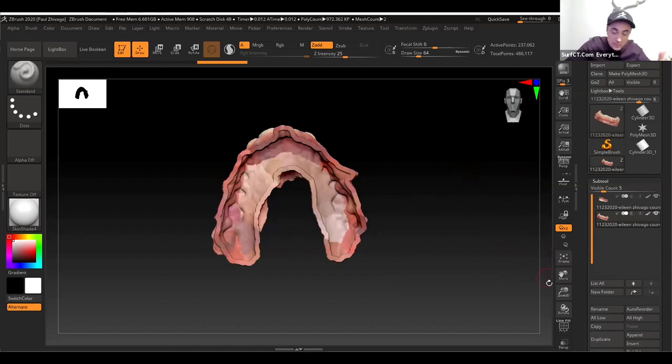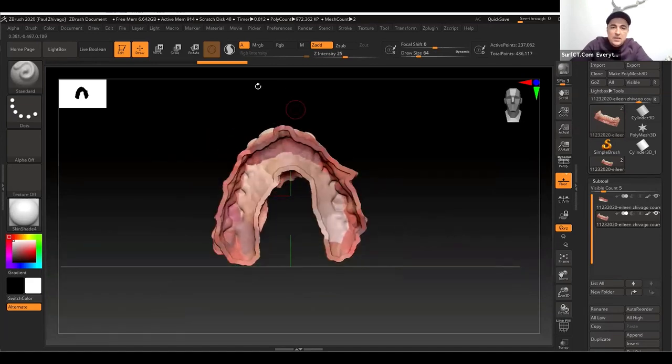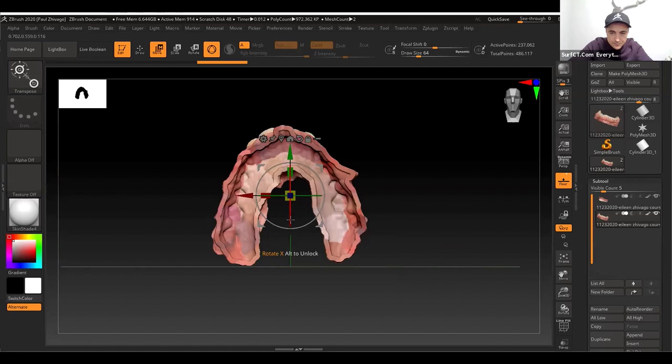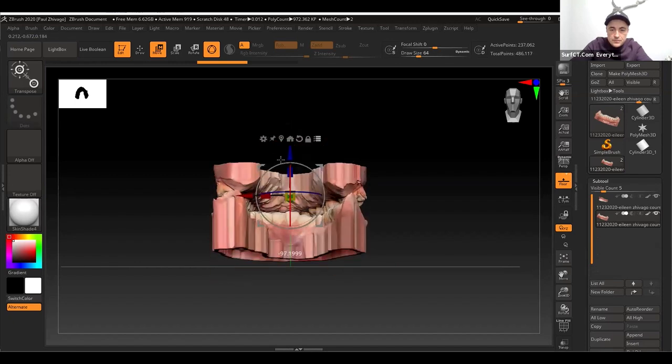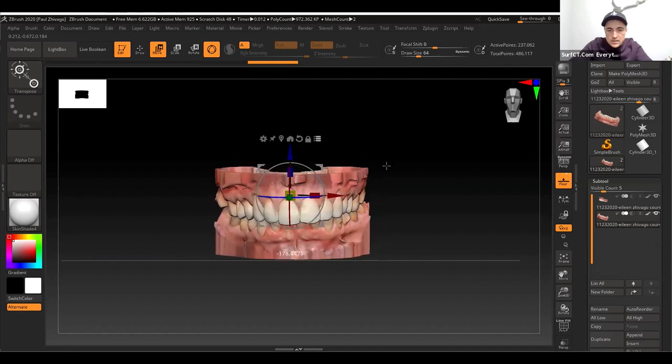And that's important now because I will work with those pictures that I generated. So I turn on the floor setting. And I can see that my arch is misaligned. So I'm going to the move brush, or panel. Sorry. Click them all on and move this in a way that it's perfectly aligned, or what I believe would be perfectly aligned.